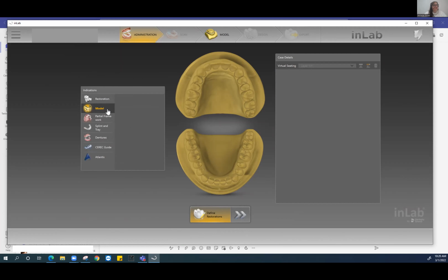But to start, I'm going to show you the model builder workflow, okay? Because again, it is important to note, where you're actually going to design a model. Again, if you ever want to 3D print a model for a partial or 3D print a model for study model purposes, whatever it might be, you're going to identify the model. Now I've selected the lower jaw. As we know, it was an upper jaw, but again, I'm just designing a model. So I'm just selecting the lower jaw because I know that that was what was selected on the prime scan side of things.